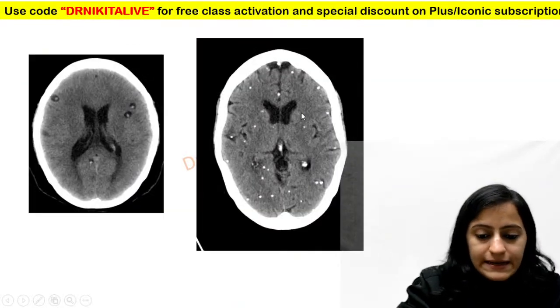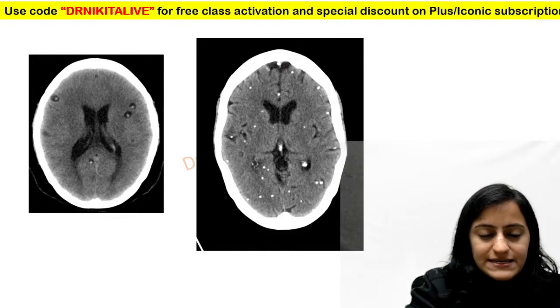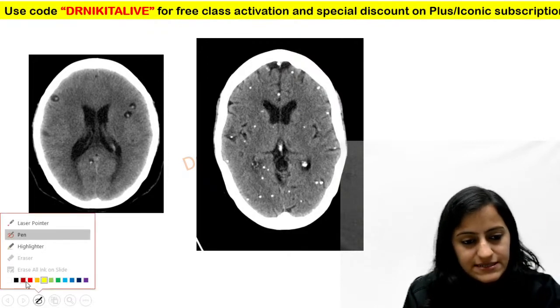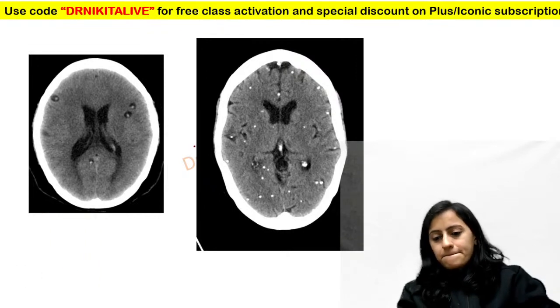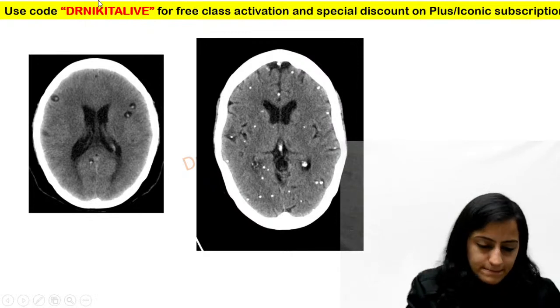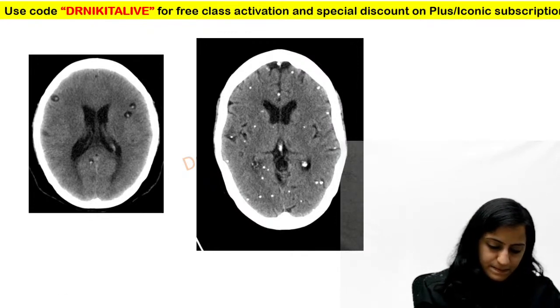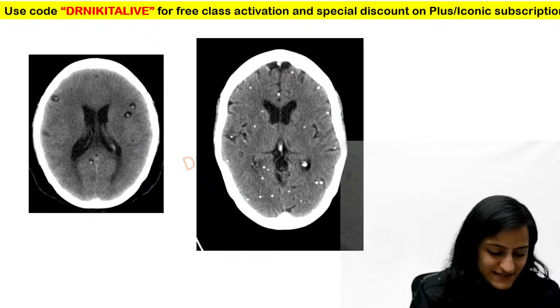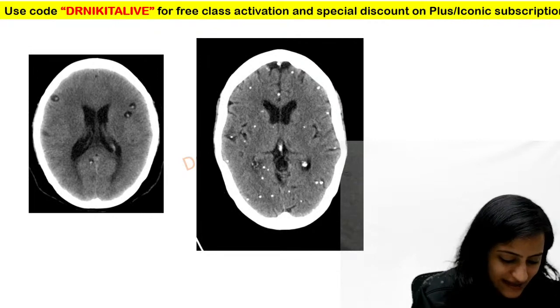Alright. Next one, identify these images. What do you think is the diagnosis in these images? Amazing. Absolutely right, Bhagraj and Bebek.